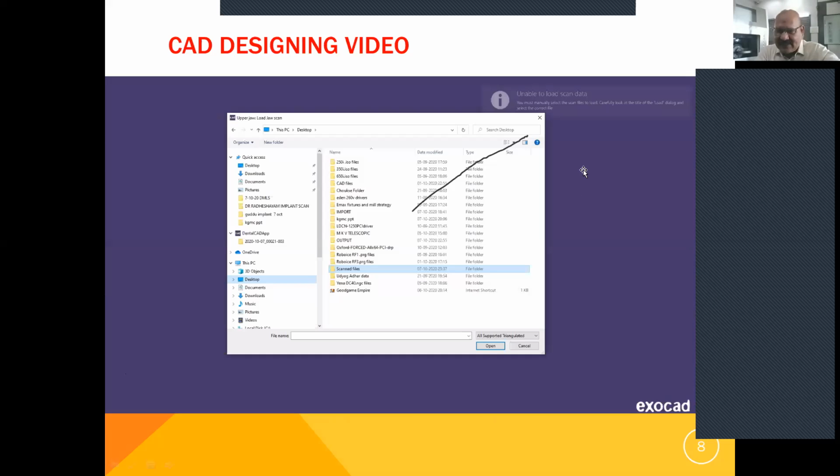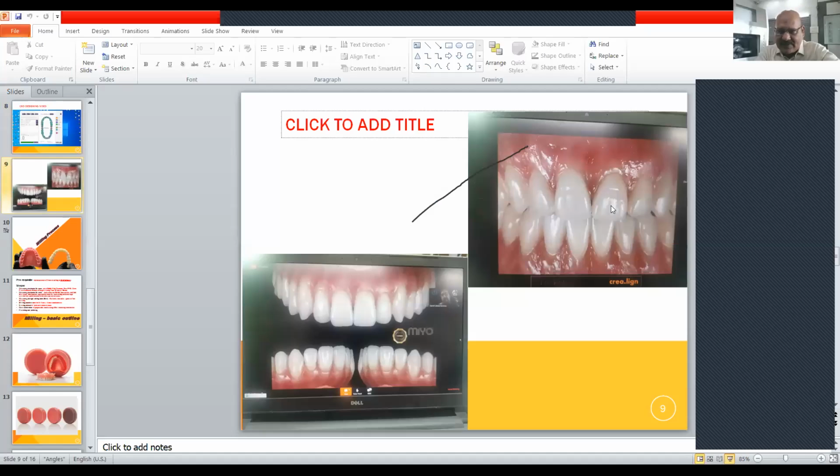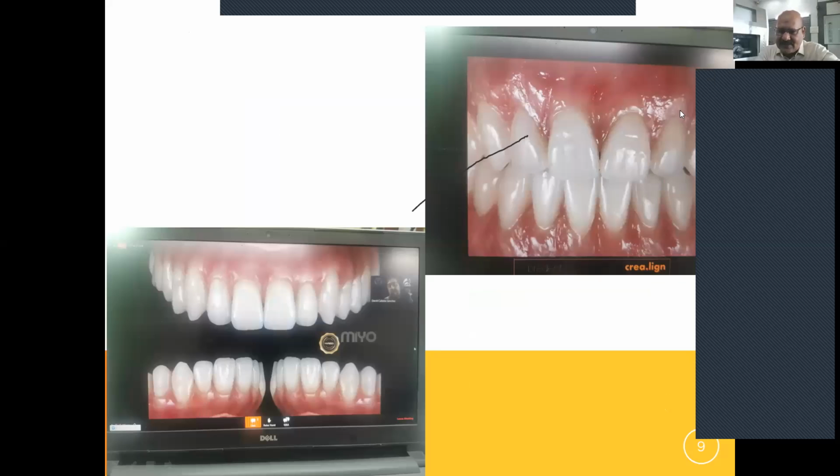These are the effects we can produce, doctor. Go into the slide mode. We can do the characterization. This is the area which I wanted to highlight. There are some lila, rosa, and beige colors. So a mix of those composite colors can give a very lifelike effect.